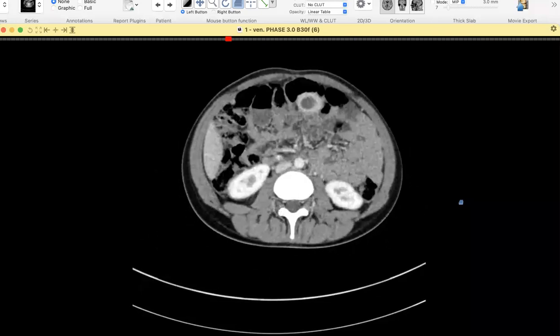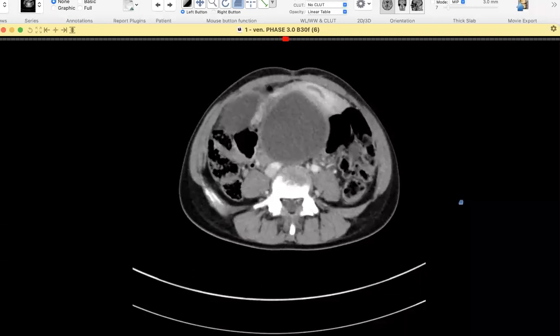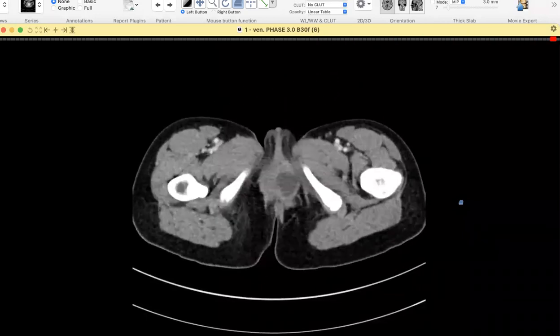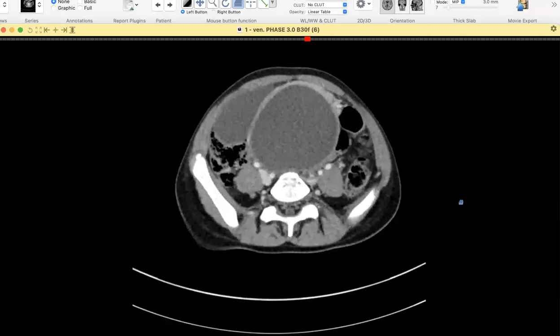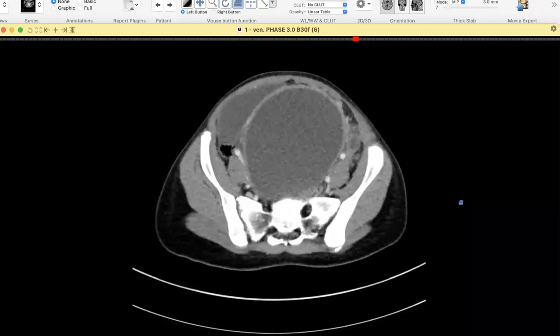So which is it? Is it hematometra or hematocolpos? Hematometra, because the hymen may not be imperforate, so the blood continues downward. So this could also be due to one of the Müllerian deformities, or Mayer-Rokitansky-Küster-Hauser syndrome.